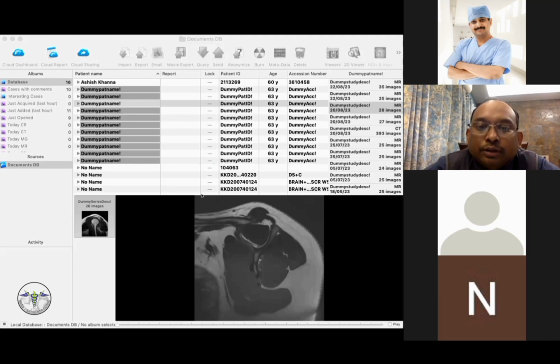No. So we have already, this is the whole length, then we have subtracted this. So then this is what exactly is left, and then we have to take it. That is what Aniket was asking. Sir, that is what I was saying, that we are overestimating. Yes, we are getting confused about how many times we have to subtract. Sir, actually the subtraction is happening twice, because the glenoid track that we take, we perhaps take the whole best fit circle as reference, and the glenoid track is on that.